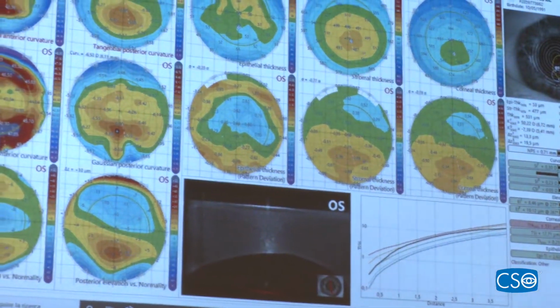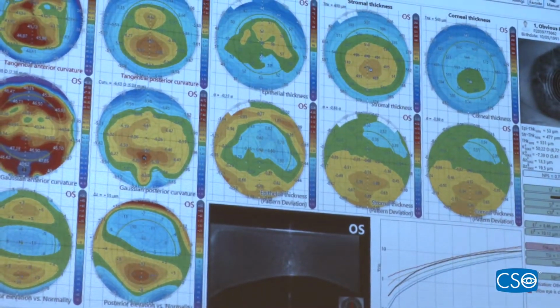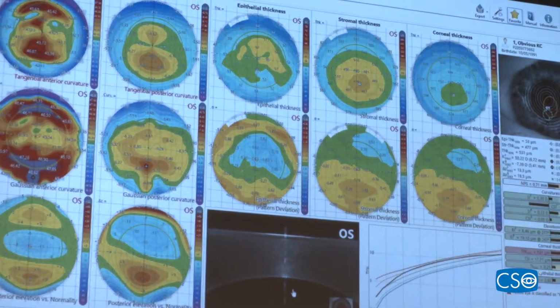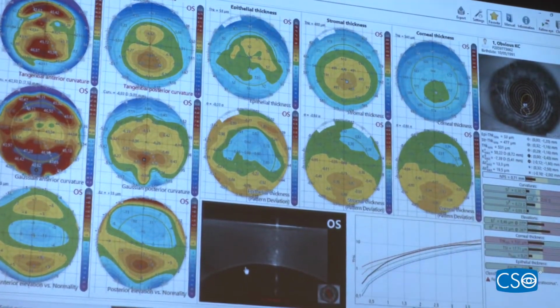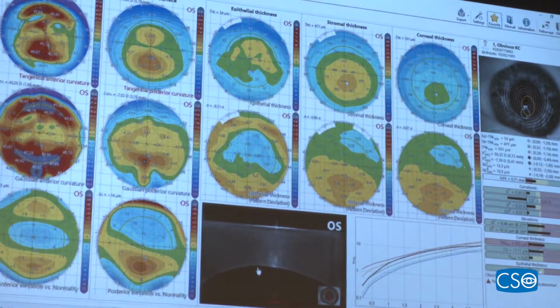Okay, so this map down here is helpful because you can actually use the mouse to rotate and see how this back surface distorts. See, here you're starting to see distortion, and there. It's visible. It's a visible cone. Yeah?